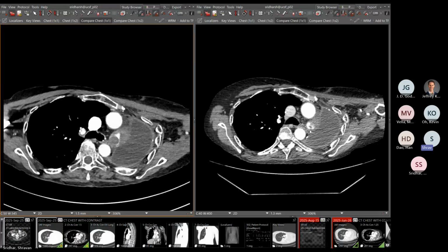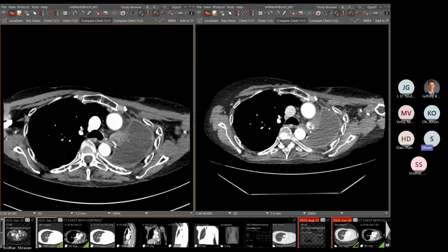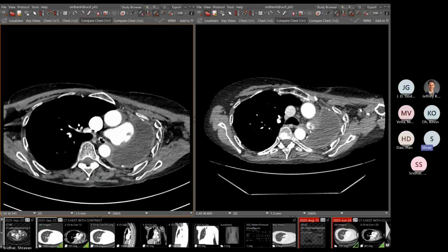But the question is, we are pretty far out from surgery, and the patient didn't develop stump thrombus early on. I saw this and my mind just went to stump thrombus, kind of blew it off. And then I came back and I looked at the filling defect along the main pulmonary artery. And here you see this starts to look really lumpy. And then slowing down and looking at everything closely, you see that this area also has lots of convex margin along this region, and there's enhancement. So this is concerning for a local recurrence of that pulmonary intimal sarcoma at the operative site.